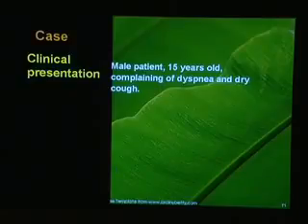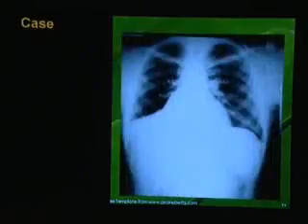This is a male patient, 15 years old, complaining of dyspnea and dry cough. Anybody want to share what's seen in the plain X-ray? Dr. Mohammed.